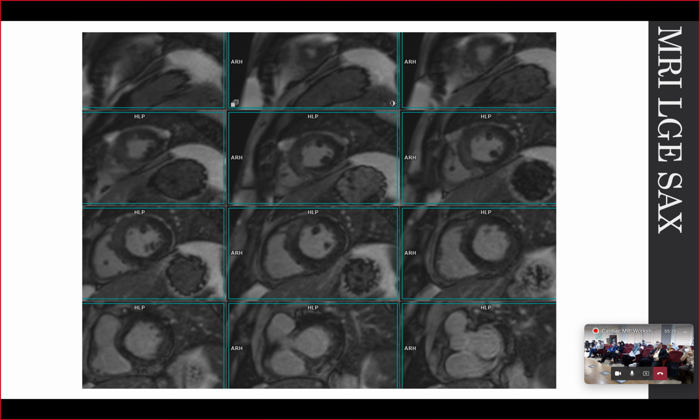The only thing that was against Takotsubo was that it's territorial, it's in the anteroseptal, as if it's following one coronary artery territory. That's why the diagnosis was atypical Takotsubo, but again, the catheter revealed that there is no coronary artery disease in this case, and this was confirmed by the catheter.